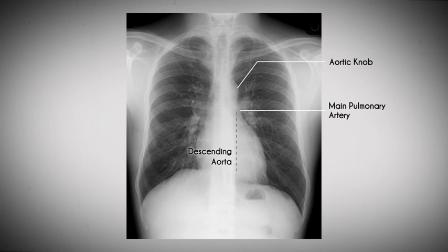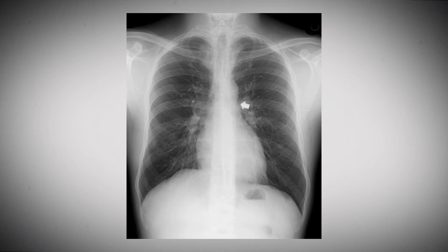In the mediastinum, notice the small bulge in the contour made by the main pulmonary artery or pulmonary outflow tract. There is an indentation between the aortic knob and the pulmonary outflow tract, called the aortopulmonary window or aortopulmonary notch. The normal concavity of this aortopulmonary window is part of the classic mediastinal silhouette, and, when obliterated, needs to be explained. Lymphadenopathy, lung cancer, and vascular masses are common in this location.